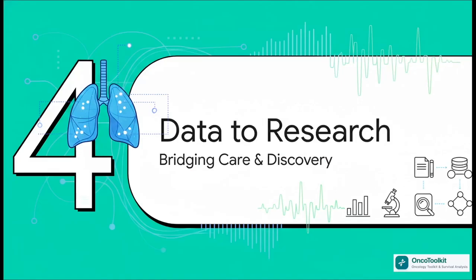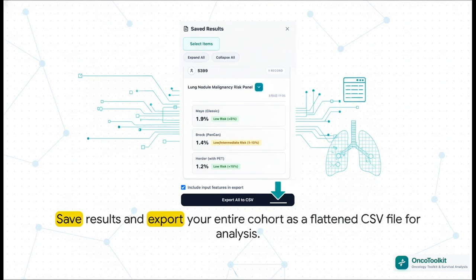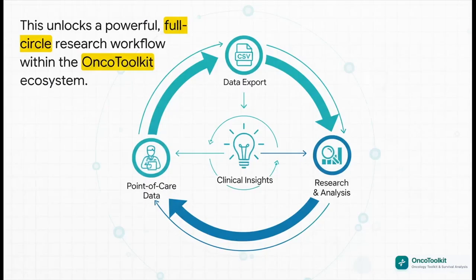Okay, so this is huge for patient care. But the tool is also designed to do something else. It's designed to build a bridge directly from your point-of-care decisions straight into the world of academic discovery. So every single one of these calculations can be saved. And as you start to build a cohort of patients, you can then export the entire data set with just one click. What you get is a perfectly structured, flattened CSV file. It's got all the input variables and all the calculated scores, ready to be dropped right into your statistical software for research. And that simple export function, it's the key that unlocks a really powerful full-circle research workflow.